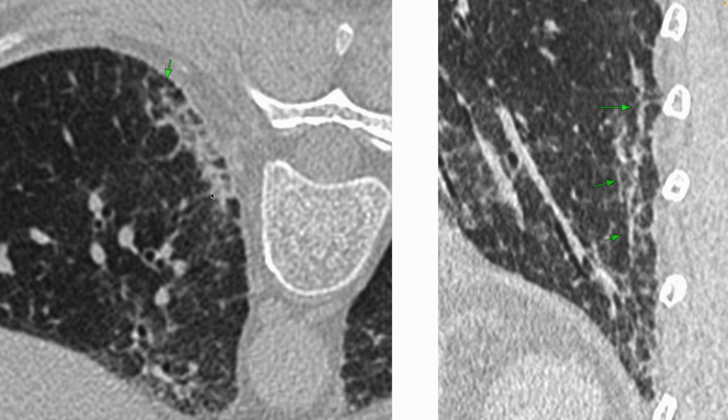And I think what is a little characteristic, probably also a combination of a little bit of subsegmental atelectasis, are these subpleural lines. They are usually less than a centimeter away from the pleura, usually within 5 millimeters, as we see here. And then we see some of these dots here and here. Also, you see intralobular, interstitial, and interlobular septal thickening as part of the fibrotic process. But it's not common to get band-like lesions, and so this seems a little distinctive.